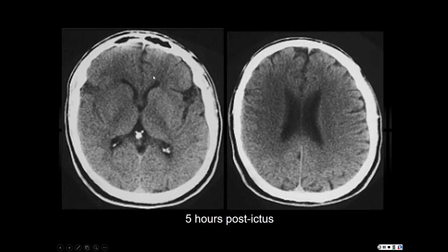We're going to start on the left. What is this big structure here? Putamen. What's this structure here? Caudate. Look how distinct this is. And I'm sorry, I can't go around the margins very well, but it looks like an inverted sail. Where is it here? It's effaced.